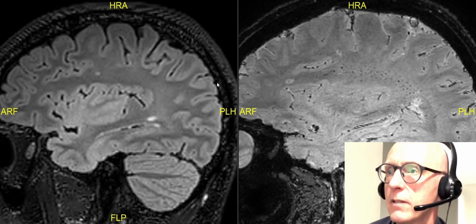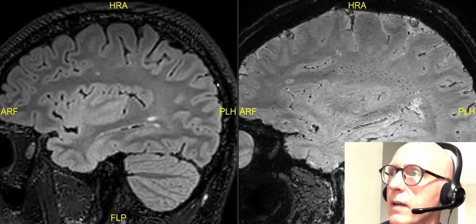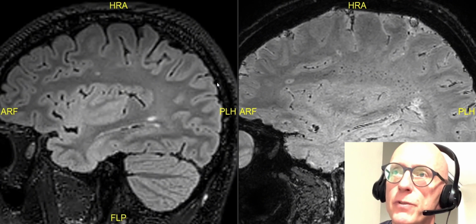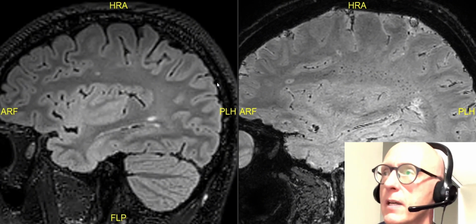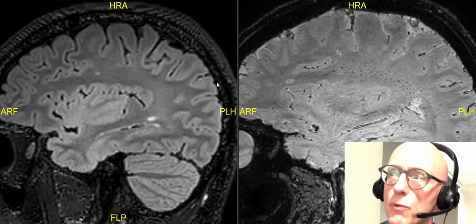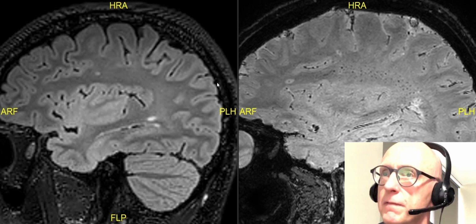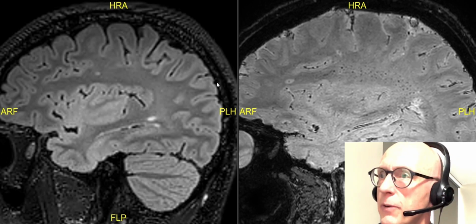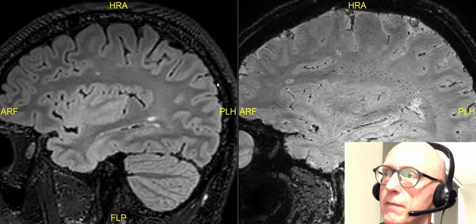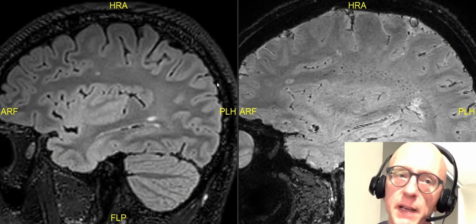Okay, so we've had a look at the central vein on a nice example case, and I've shown you a few lesions which I think were central vein sign positive. But what I'd like to do now is drill down a little bit more into the process of selecting lesions for evaluation and the actual criteria that we need to apply for deciding whether a lesion is vein positive or negative.